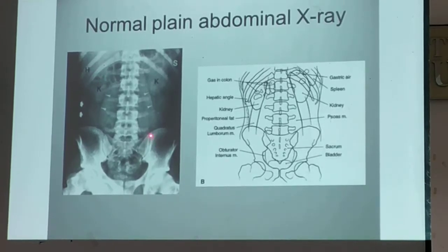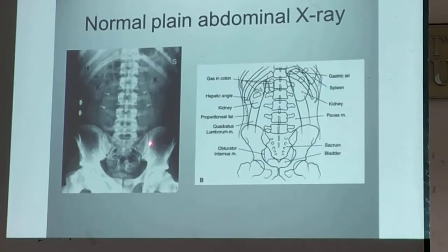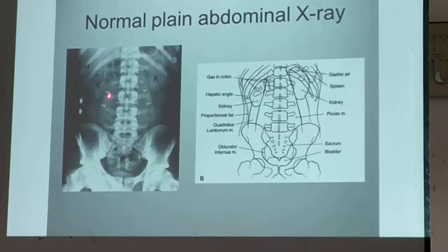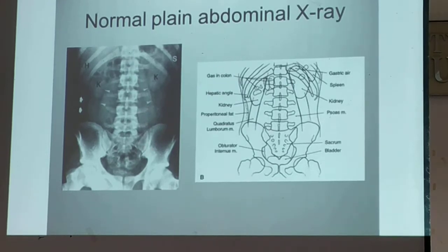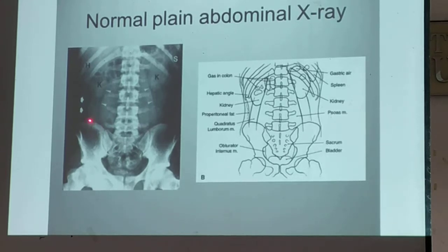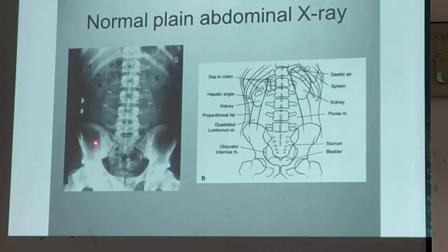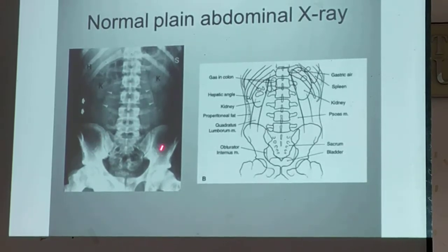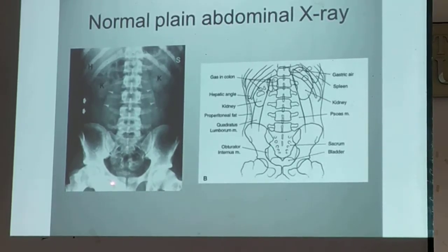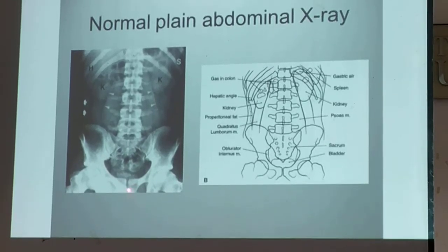And then I gave you this bone here. This is your left ilium, and then the left sacroiliac joint. Okay? So these are important landmarks. So when you see this, you don't see both diaphragms, so this is more of a KUB examination. Plain KUB, okay? Because the pelvis is fully visualized. Okay, the symphysis pubis, I gave you that, that's an important landmark. Okay?